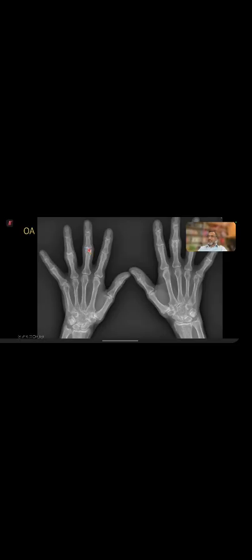And here you can see the undulating surface, marginal osteophytosis, more loss on this side, less loss on this side, and osteophytosis is more on one side. On the other side, you can see there's a cyst as well, maybe some enchondroma there, but look at the osteophytosis, it is more on one side. So you can see that even though it's a small joint, joint space loss is not symmetrical.